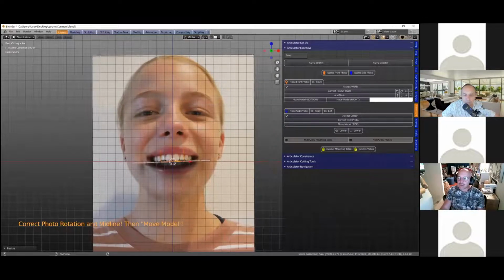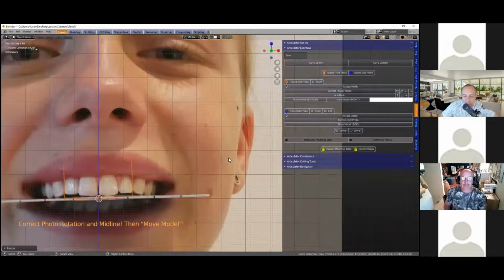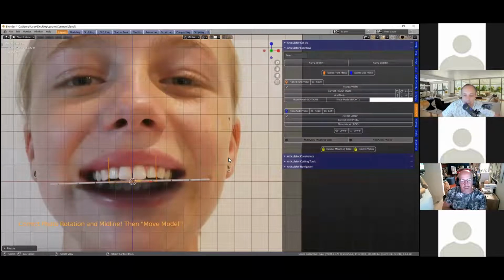The midline is an arbitrary position in space unless you completely measure the entire face, then you'll get the perfect result. But at the moment, we're looking at the patient and trying to get the midline correct. And it's not easy because a photo may have been taken a little bit from the side or from the top or the bottom, and then your nose will be out, for example. So it is a bit of guesswork, but more of an educated guess. And also photographic skill, so you can make sure the lens is exactly lined up with the patient's face. And of course the card, because we're trying to get a thin edge of the card, so we know the horizontal plane is in line with the 3D plane.